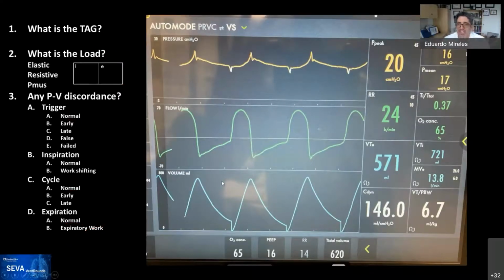This one is also fresh out of the screen of a patient. So any fellow wants to read this one? That is not in a cafe. Or anybody. I have no problem. Have no fear.